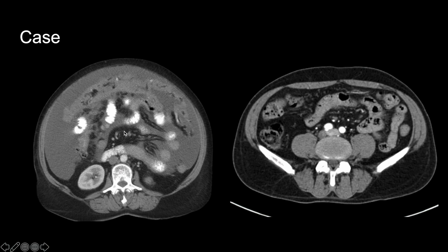And although this case here is very obvious and the greater omentum is a very big structure, if you're further along, it's worth learning the more intricate peritoneal anatomy. The more of the anatomy you know to a point, the more subtle pathology you're going to pick up on CT scans.